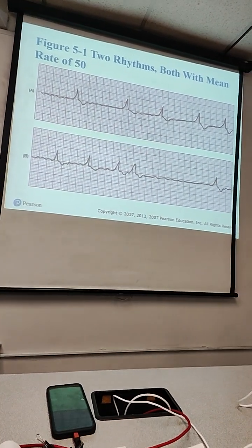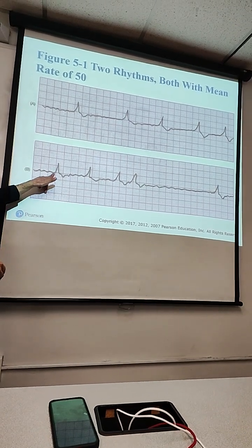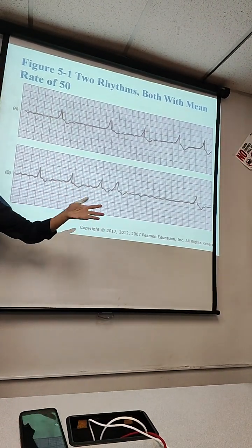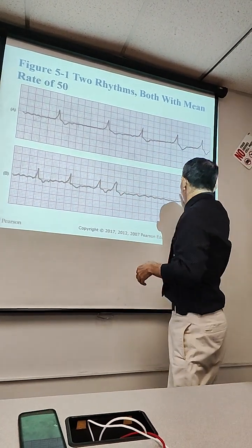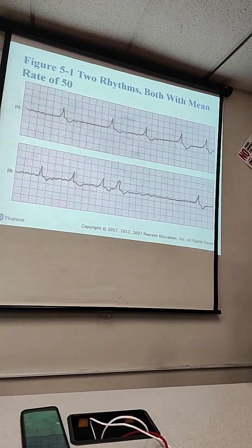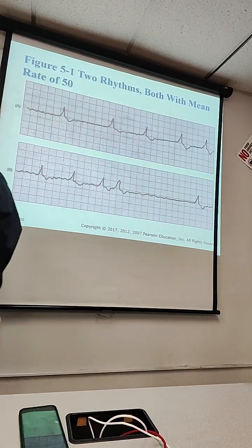Who can understand that? Doesn't follow any directions. It's everywhere. I cannot count. See, where are the intervals? I don't see the intervals. I'm not gonna be able to count the intervals, and some of them I will be able to, but then one is longer than the other. See, they are separated different distances. I don't know what's really going on right there. So that is chaotic. That is irregular. The fact that they are not following the same pace means the rhythm is irregular.